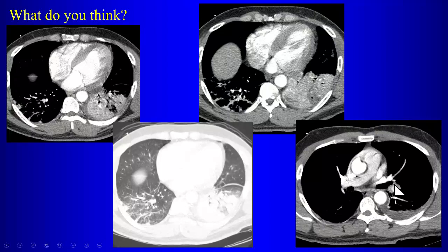What other abnormality do you see? Well, what is this? Pleural effusion. What is this over here? Atelectasis. Or is anything strange looking about that? Jose? What's wrong here? I mean, we have a part of that consolidation that's perfusing, there's air in it. So what's your interpretation then?